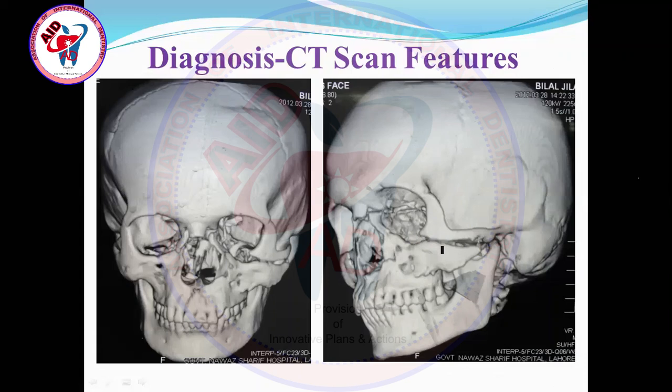But commonly, tripod malar fracture, tetrapod malar fracture, that is the zygomatic bone fracture, from its different articulations it gets fractured. But this is an atypical fracture going mainly through the body of the zygomatic bone. If you visualize this on the infraorbital margin, there is step deformity, and the fracture has gone posteriorly in the sagittal plane, from anterior to posterior, through the body of the zygomatic bone.